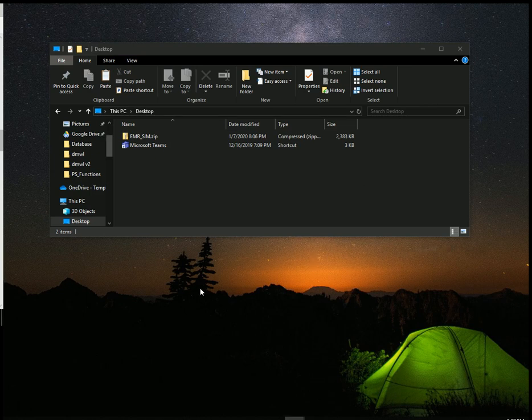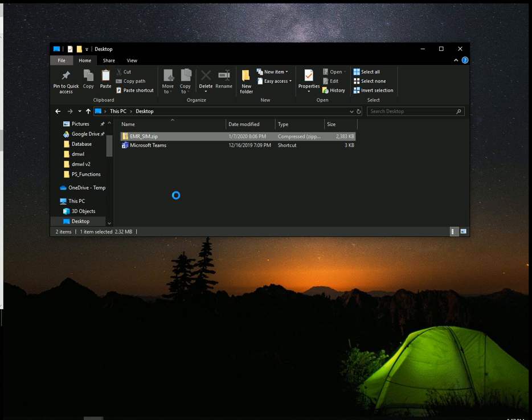Just my quick tutorial on how to use my poor man's EMR, which is just written in a PowerShell script. Basically, it's going to simulate registering a patient and then being able to send an ADT, and then from that ADT, the Modality Worklist server displays results based on some automatic configuration for procedure codes.